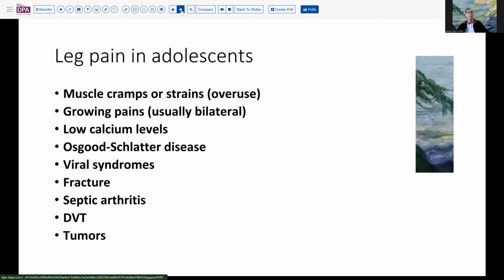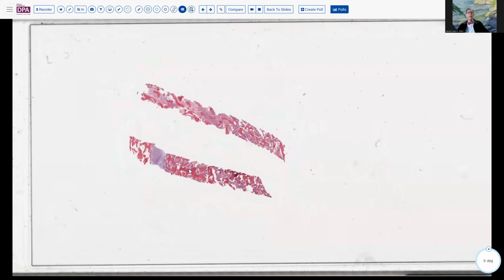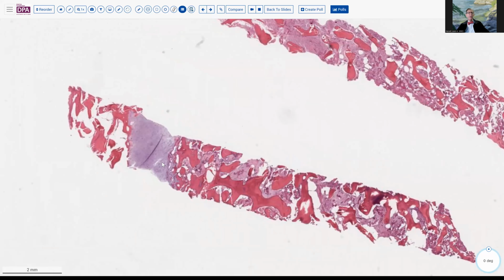Of course, in our circumstance, as pathologists, you don't necessarily know this full backdrop, but you just show up one day and you've got a needle biopsy of a bone. And that's what happened with this patient. Here was this needle biopsy. And as we can see, it's got an intact growth plate here. You can see the cartilaginous tissue here.